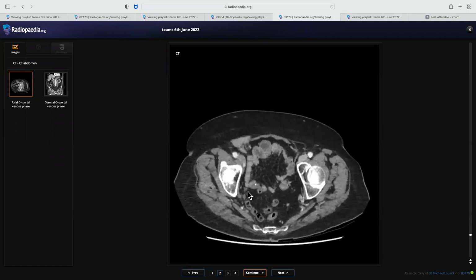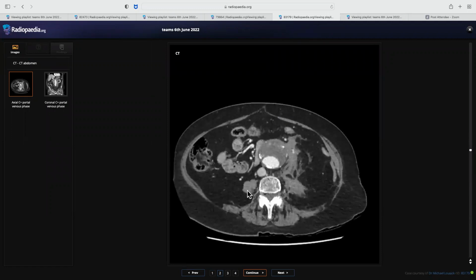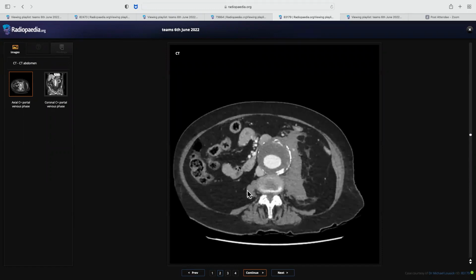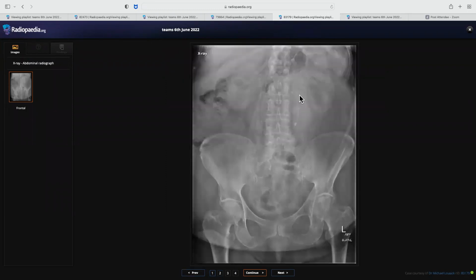So here, I was asking you about the site of leak, it's fine. In the exam setting, it can happen that you can't identify the site of leak, but very well, you can correlate that on the radiograph. What was there on the radiograph? There was loss of the psoas outline, or you can say the psoas outline appeared to be bulky here. Right. So that was the sign.